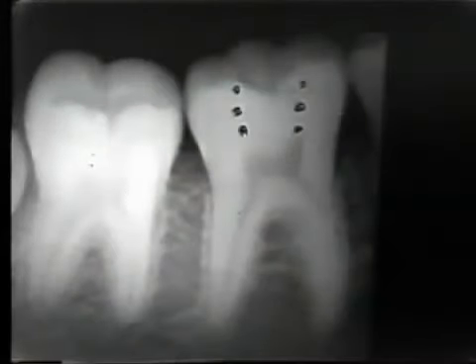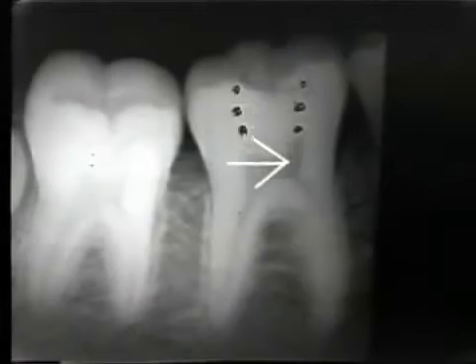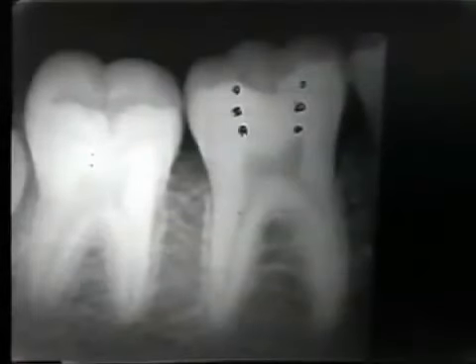Here's a radiograph in which the pulp has been somewhat accentuated and comes up to the occlusal surface. It's because many students have trouble visualizing in a mesiodistal direction the dimensions of the pulp. So study the pulp, study the radiograph, note that the pulp on the mesial comes about halfway between the central pit and the marginal ridge, and on the distal the pulp comes to about the distal pit.